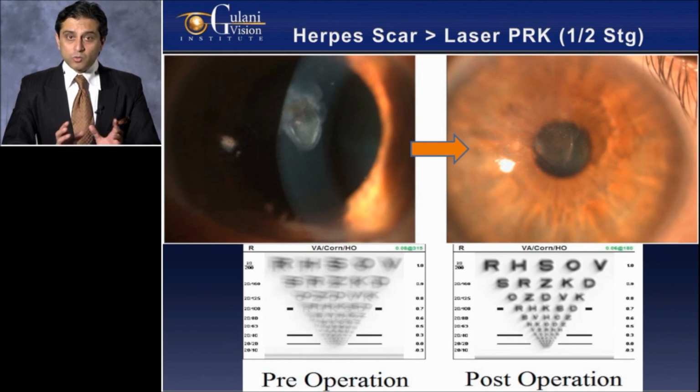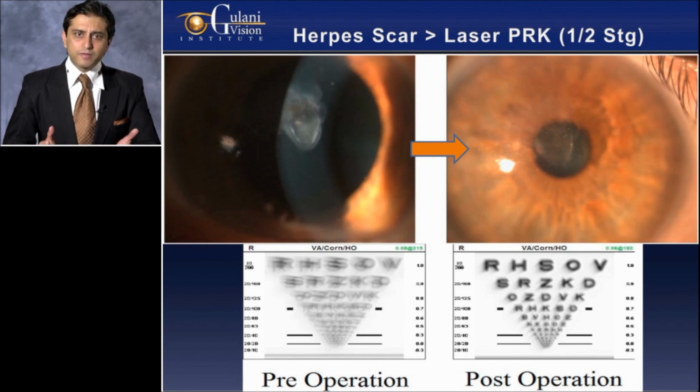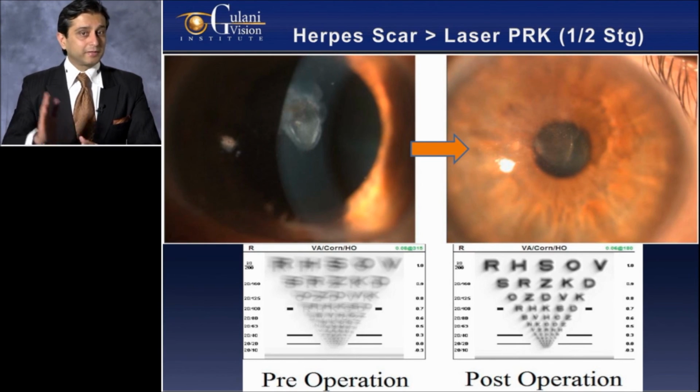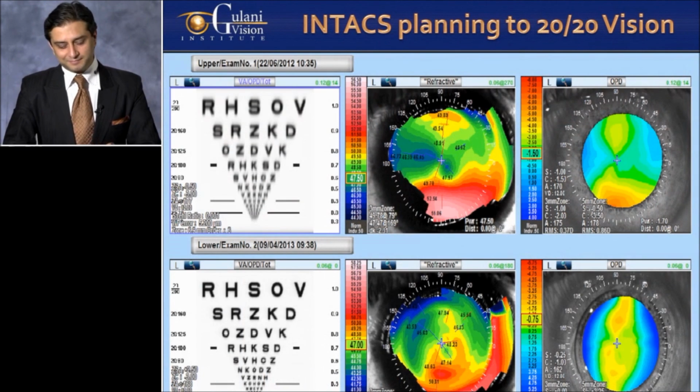And now you can actually quantitate why this patient is thrilled, because to me, he's still not 20/20, he's 20/50. But he's thrilled beyond belief because his quality improved. And you can also confirm that with technology using the OPD and say, okay, now I understand why you're so happy. And from here, you also understand another element in this gentleman, because he was in his late 50s, maybe down the road he'll need cataract, and that internal OPD is something we'll tackle at that time.